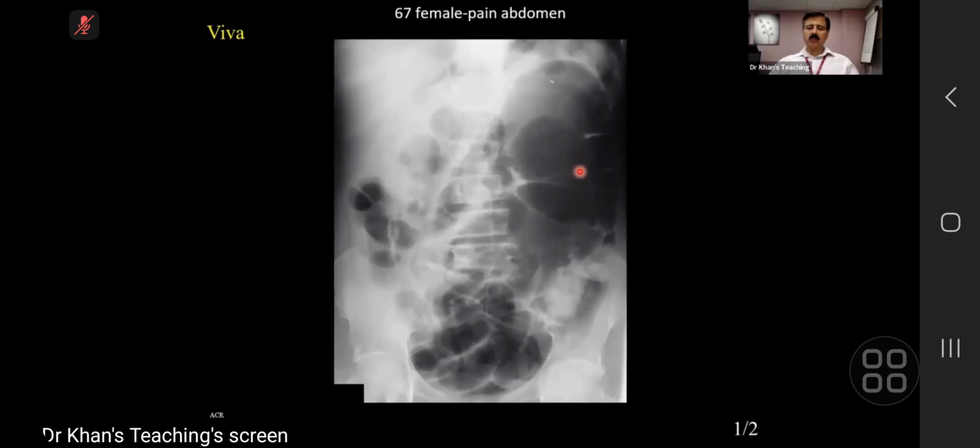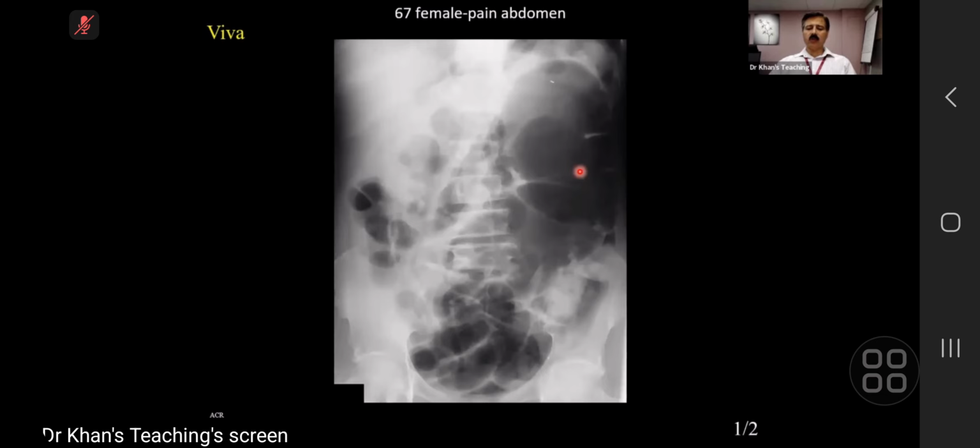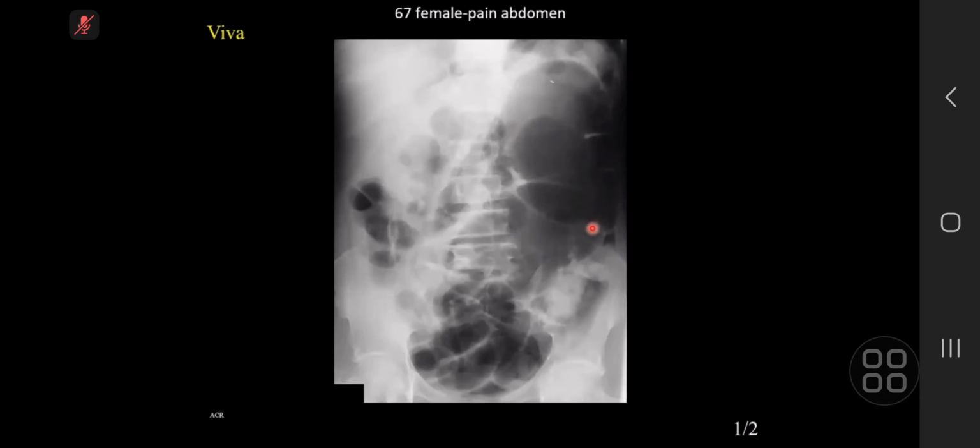One of the principles of large bowel obstruction, you remember, is that it can be with the ileocecal valve either patent or not patent. So small bowel is a tricky finding. You should never make the opinion that you will look at the small bowel and then conclude. Your basic principles are the same. You have picked up that this thing has got haustra. Now, if you see haustra, then this is not sigmoid. And please remember the basic concept.